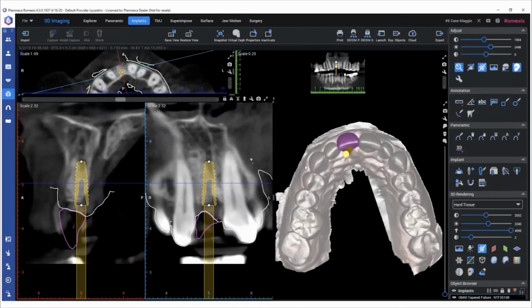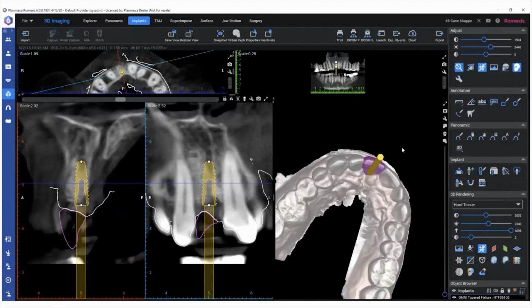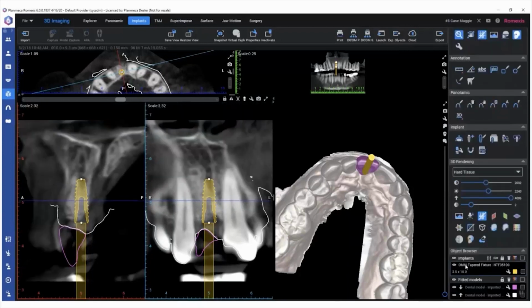And this is how I set up all of my plans. On the left side, I put the implant-centric view, meaning we have cross-sections using the implant itself as the long axis for the radiographs. So this is absolutely essential, in my opinion, to have it in that view. A lot of things that you can see on a cross-sectional view or a traditional two-dimensional view, you're kind of missing out. So implant-centric view obviously is very important.